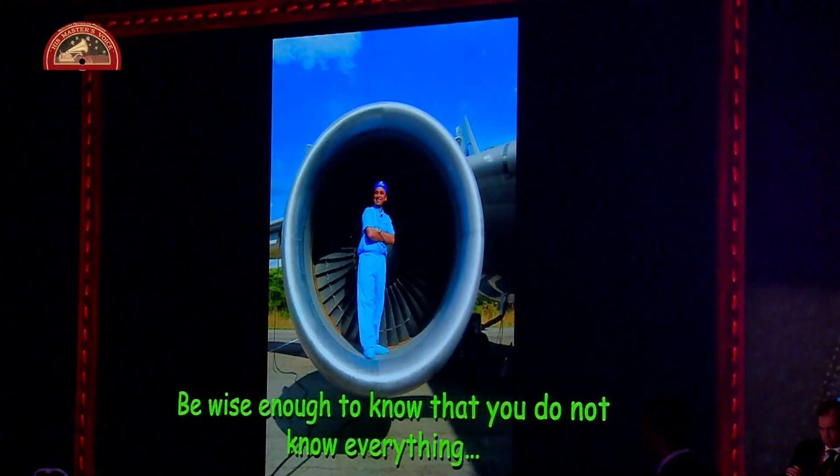Thank you very much. Sneha, you want to tell us something about how we can use this machine for IOL power calculation in those abnormal corneas? Yeah.